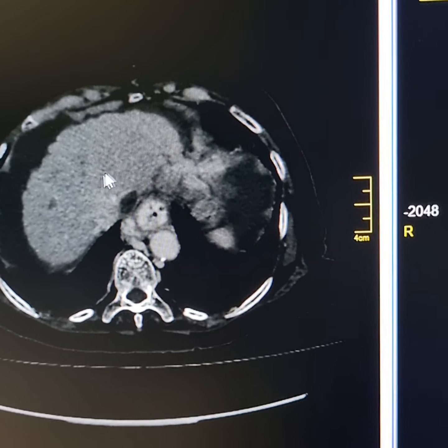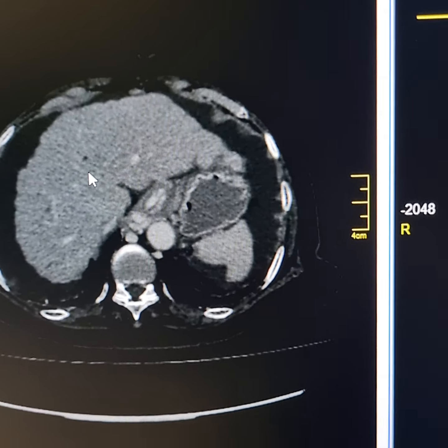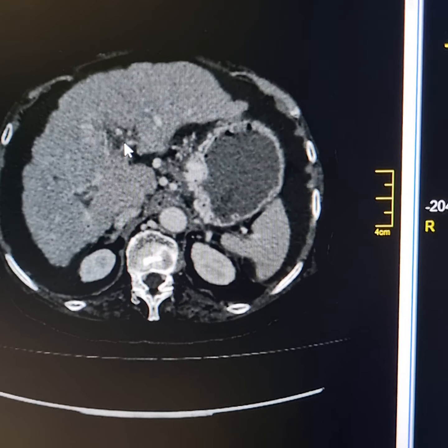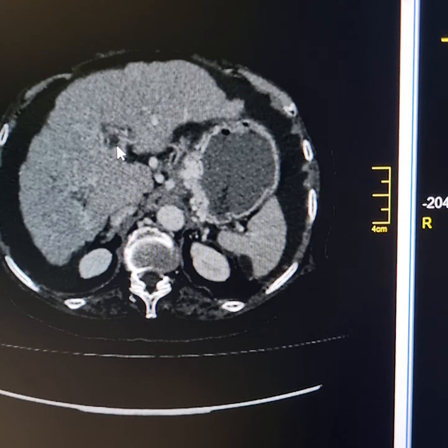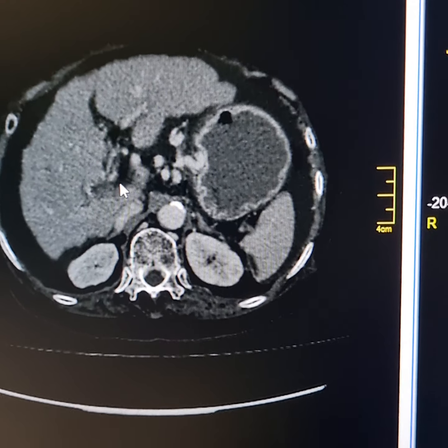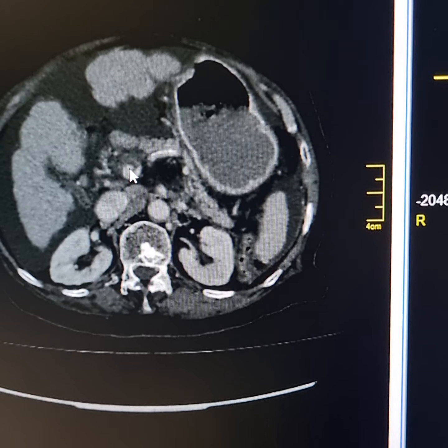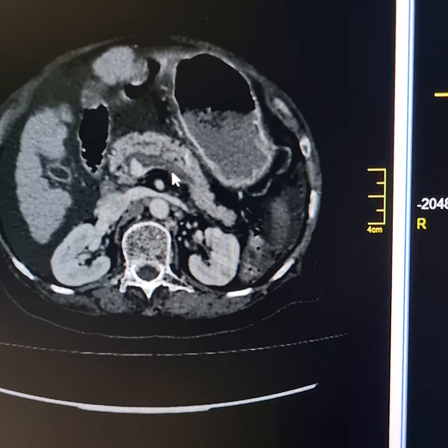Now please follow these lucent channels downwards. This one here, this one here. These are traceable up to the levels of both branches of the portal vein. These are almost completely thrombosed. The thrombus extends into the portal vein itself, which shows mild to moderate luminal narrowing.